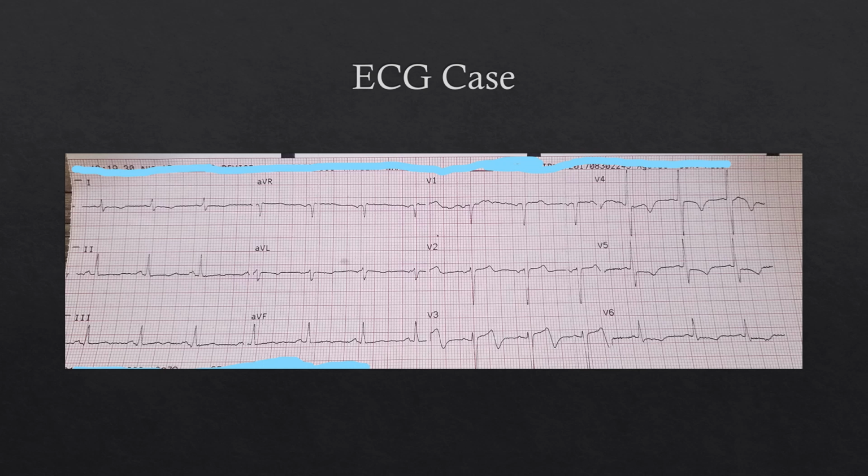Had you taken an ECG during the time when the chest pain arose, you would have most likely seen ST elevation and a classic anterior STEMI pattern. But due to the reperfusion of the myocardium, you're getting this T-wave pattern here. And you can think of it almost like a TIA is to a stroke, except maybe a little bit more severe in this case for this patient's at high risk of reocclusion. And so this is definitely somebody that we want to get to a PCI facility to make sure that we can catch them prior to reocclusion and going back into that anterior STEMI pattern.